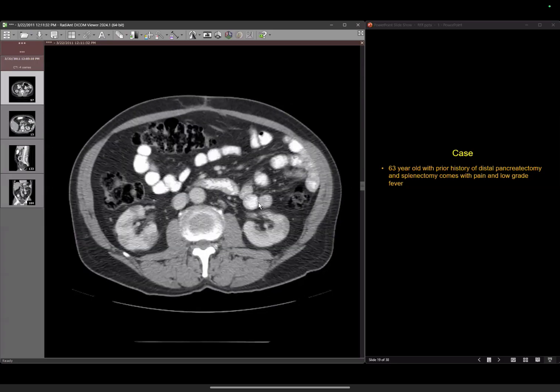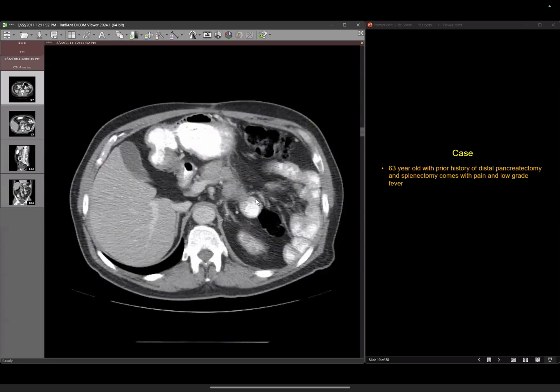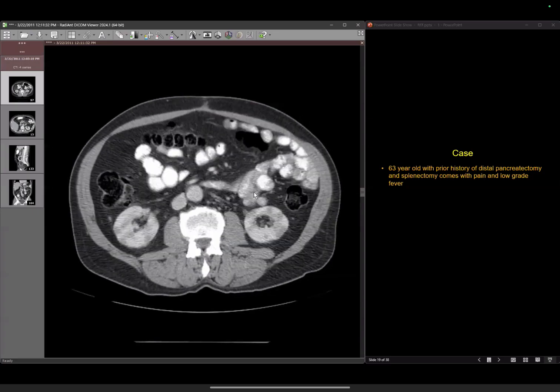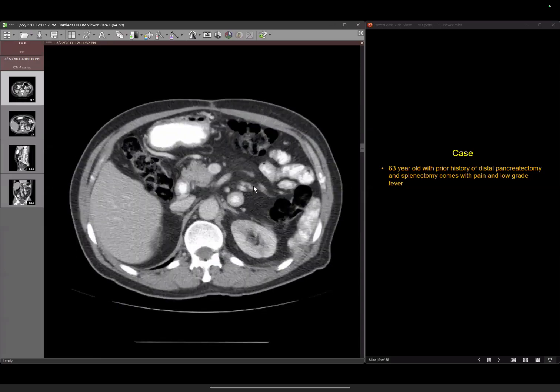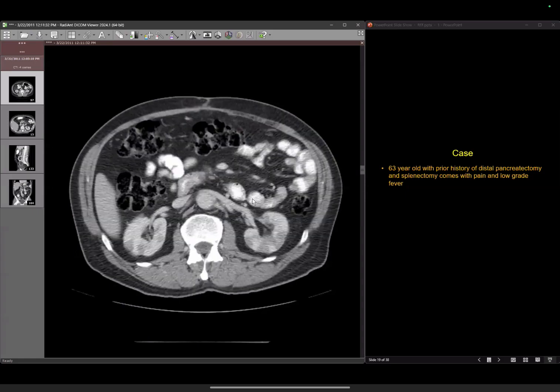Could this be lymphoma? Yes, it could be. So lymphoma is one possibility, but then there are lymph nodes. No other lymph nodes could be seen. Yeah, there is no lymphadenopathy. Exactly. That makes it, again, less likely, although you can sometimes see that.